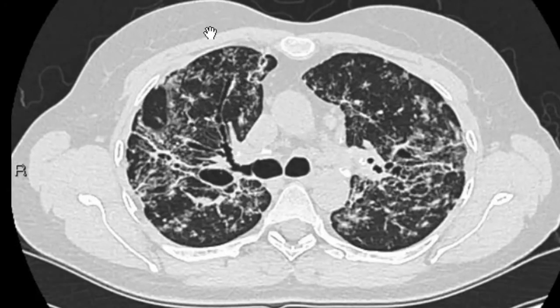On this image, you can also see what are known as perilymphatic nodules visible in both lungs. These are nodules within the interstitium which can be subpleural. They can also be present along the fissure or along the interlobular septae and or adjacent to bronchovascular bundles. But before I continue on this, I want to show you another image from a different patient.